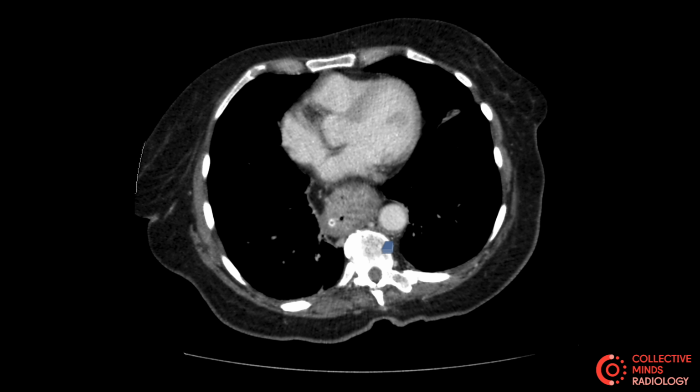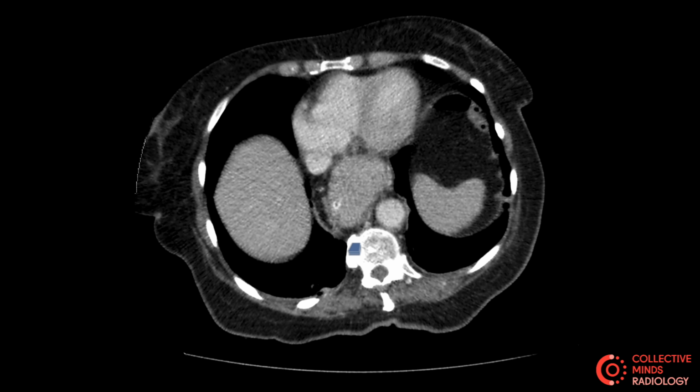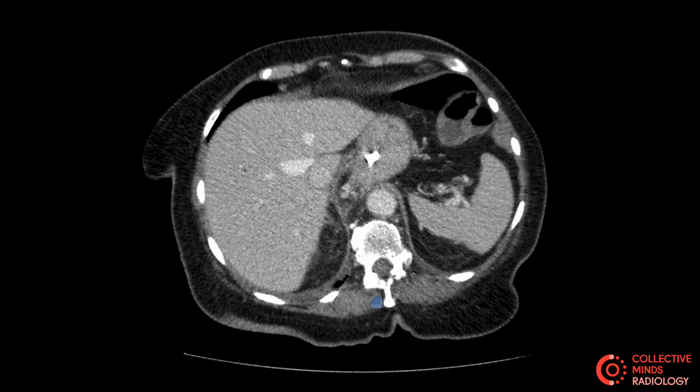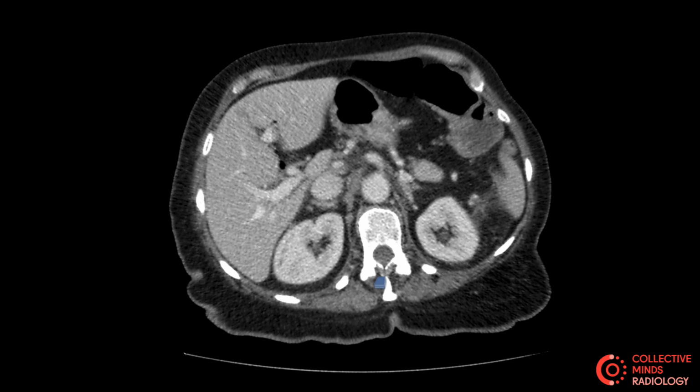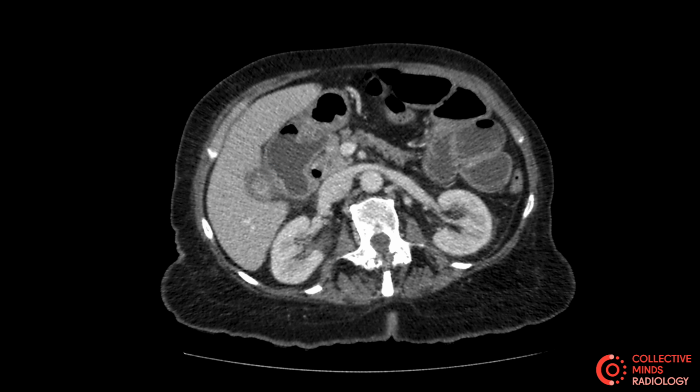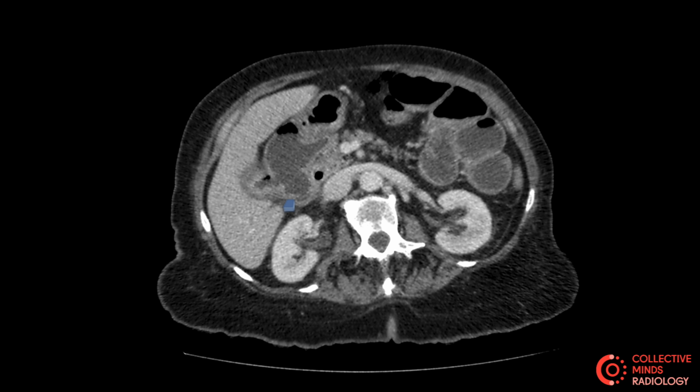So now you know where the aorta is, you know this is a contrast study from what we've seen before. Let's follow the bowel, let's follow the rest of the scan. So if you go to the rest of the scan, we're looking at the gallbladder, and the gallbladder is sitting within this region in the context of abdominal pain. And actually you can see that there's a bit of fluid around it, and actually the gallbladder looks slightly hyperenhancing. It looks like there's a dense line around it, and it looks very, very shriveled up, so that doesn't look quite right.